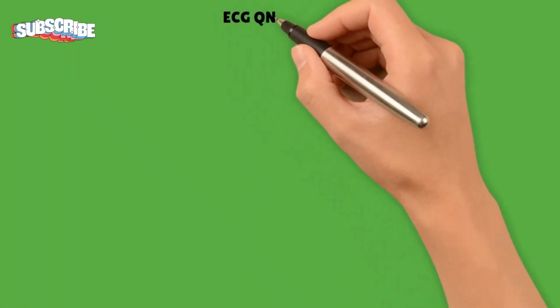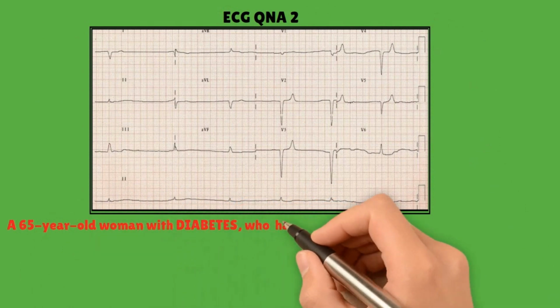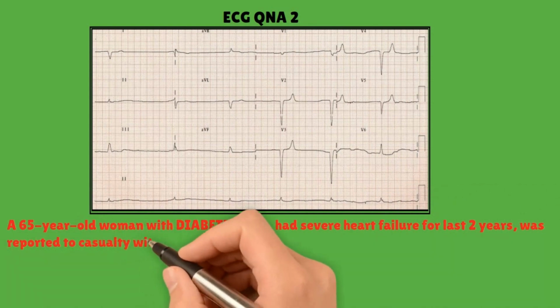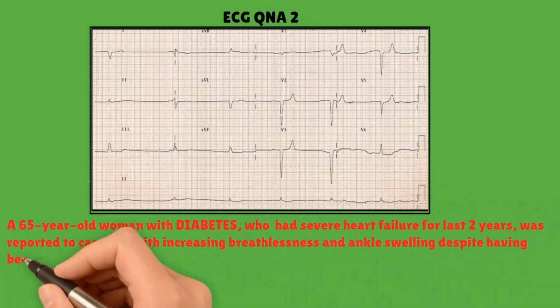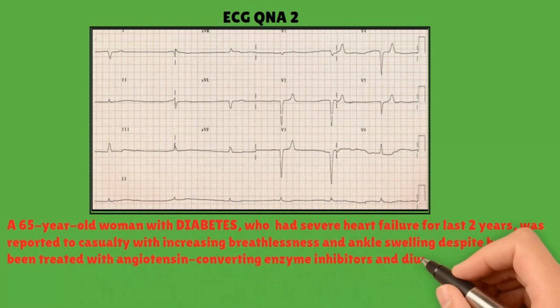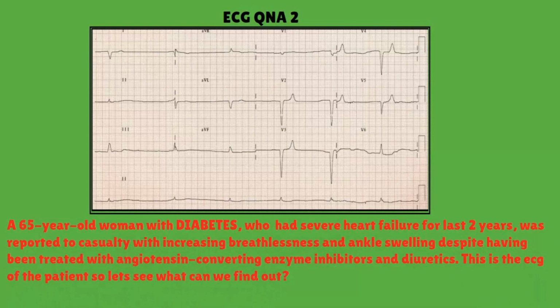This is ECG Q&A number 2. The question is, a 65-year-old woman with diabetes who had severe heart failure for the last 2 years was reported to casualty with increasing breathlessness and ankle swelling despite having been treated with angiotensin converting enzyme inhibitors and diuretics. This is the ECG of the patient, so let's see what we can find out.